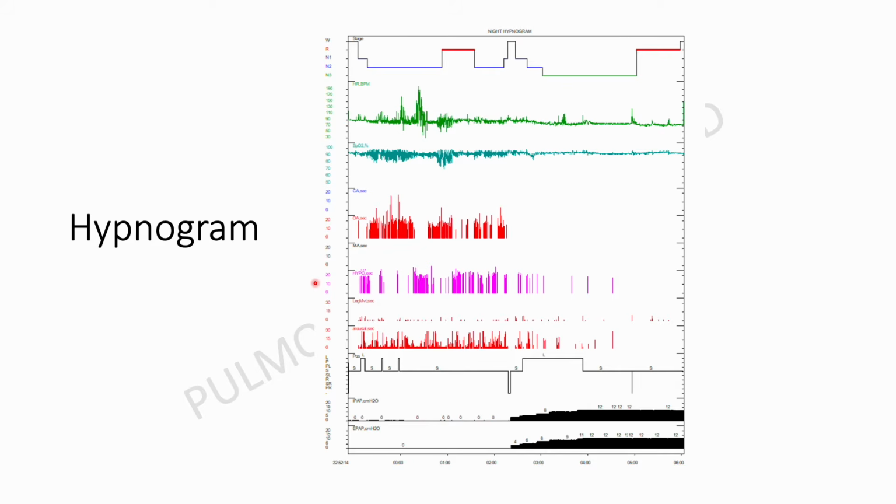And in this talk, we are not talking about scoring. Then you have the hypopneas, the leg movements, the flow limitations, the arousals, the patient position. So whether he slept on the left or the supine or prone, which again has a lot of implications in phenotyping the OSA. And because this is a split night with BiPAP titration, you can see the IPAP and EPAP and how it went along.